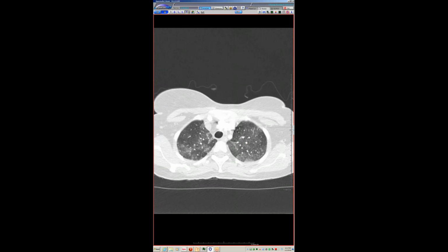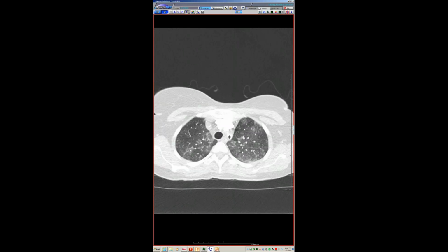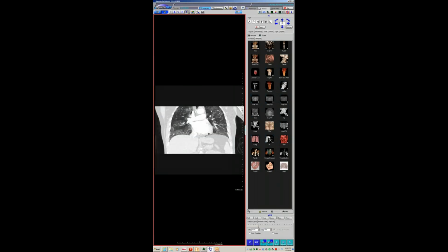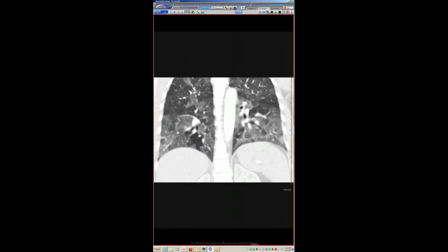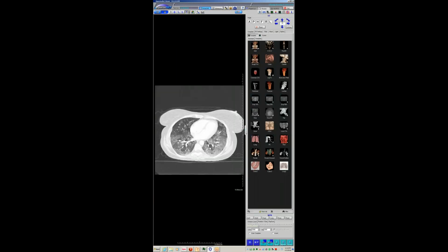but really nice, ill-defined centrilobular nodules. And if you just see the generalized pattern of centrilobular nodules in the upper lobes and ground glass in the lower lobes with mosaic attenuation, I always tell my residents that you should think of hypersensitivity pneumonitis. But this amount of ground glass is a little pronounced even for what I kind of term the inflammatory phase of this process.